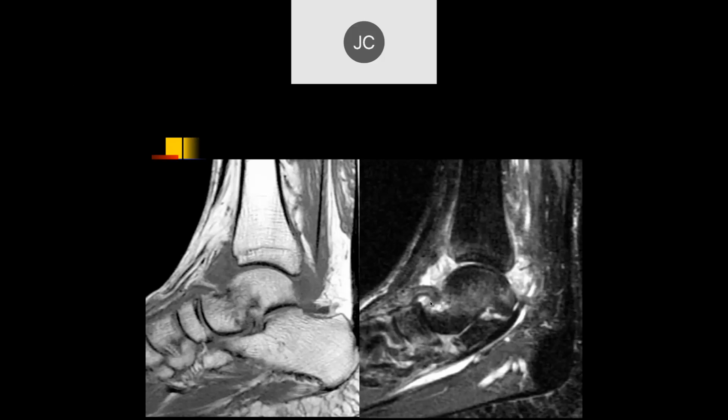Moderate to large ankle effusion. This looks kind of complex. There's some debris in there. So it's probably mostly synovial thickening then, or something to do with debris, not just an effusion, right? Yeah.